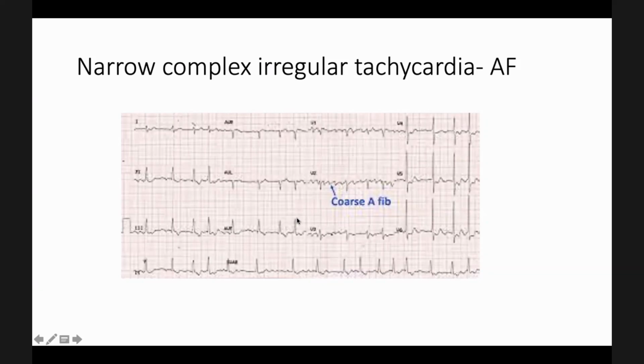These are the 4 features that you have to comment on when you are talking about the ECG, atrial fibrillation ECG. Okay. So how do you manage the patient with atrial fibrillation if they come with acute atrial fibrillation? Some patients are acute, some are chronic. In chronic atrial fibrillation also, there are several causes. So I'm not going to discuss all these things.